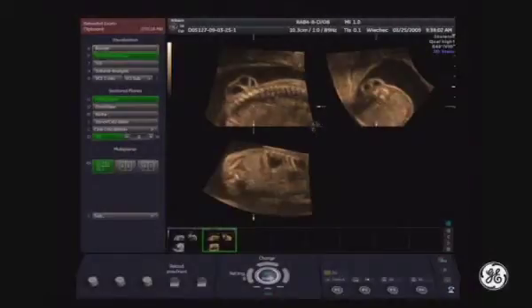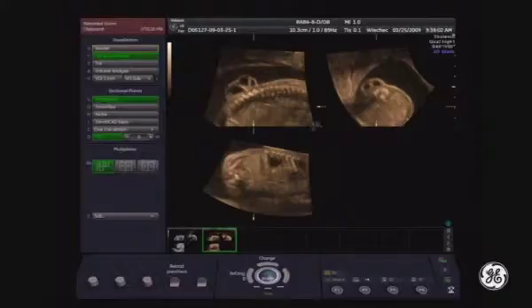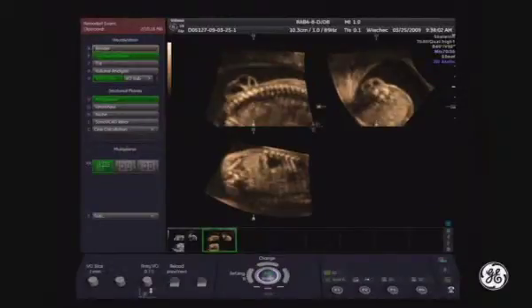This is a volume that presents a spina bifida. It's not of major importance to visualize the superficies of the defect, but in fact it is much more important to evaluate the level of the problem. So here I will use static volume contrast imaging first to enhance the quality in the B and C reference images. See the difference after I select volume contrast imaging. The B and C are really better.